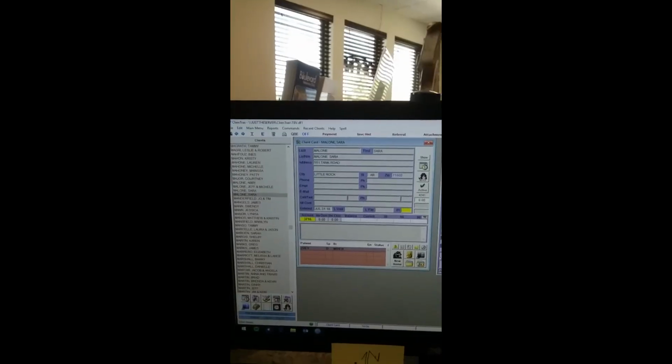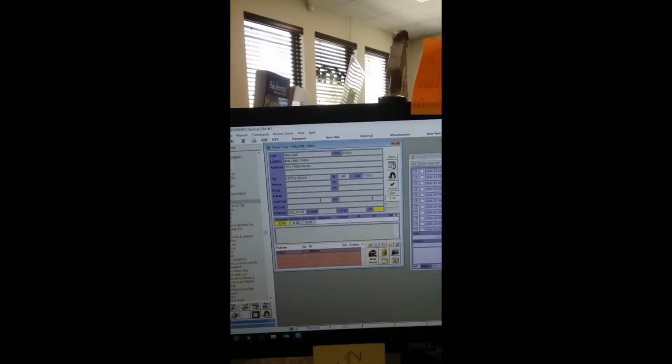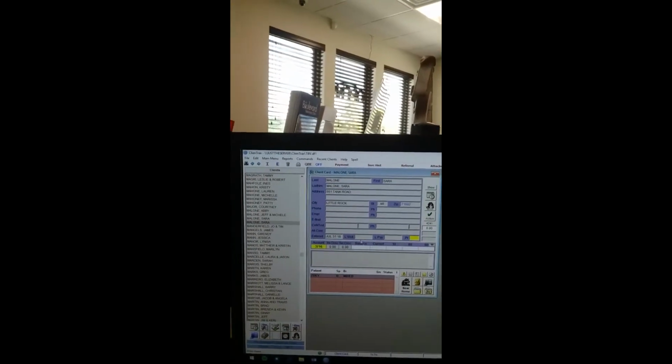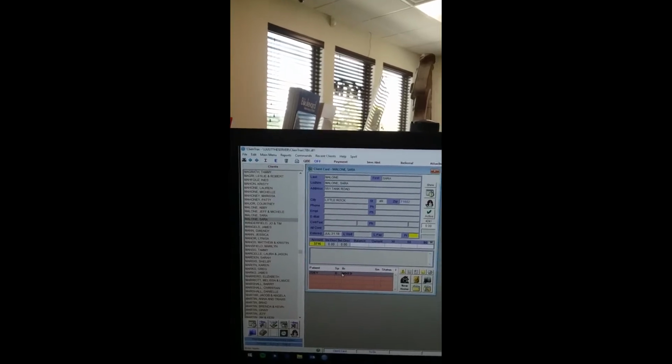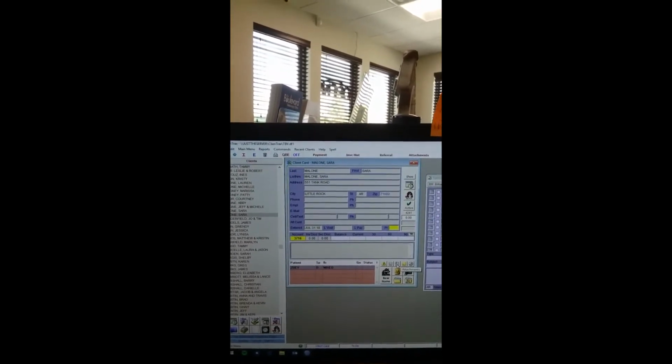So here we are, we're going to fill out our radiology log. Let me see if I can get close enough to where you can actually read it. Okay, here we are at the reception desk. I've pulled up Sarah Malone as the client, double clicked, there we are. I click on Zoe because that's who we're attaching it to.